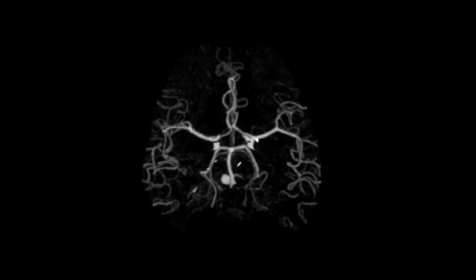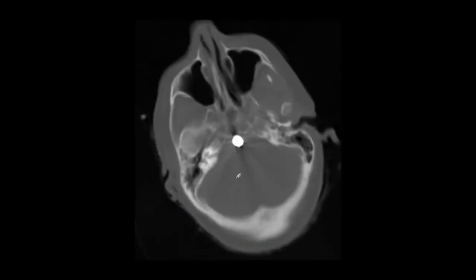And the CTA demonstrated. This is probably going to be an MRA because I don't see much of the bone clipping. Sometimes, no matter how much they clip, you can see a little bit of bone. So in the MRA image, you can see the aneurysm. That is the right side of the basilar artery, close to the vertebrobasilar junction. They went ahead and coiled it. And here you don't see the aneurysm anymore because it's probably coiled and narrowed. Usually you see streak artifact on a CT.